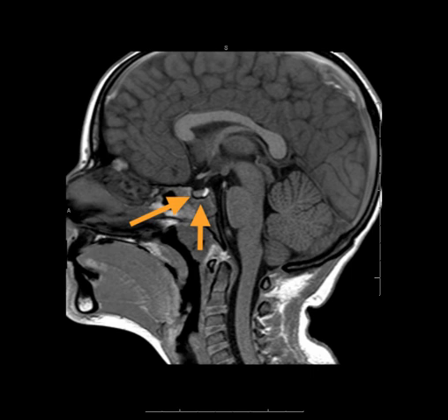The flat portion of the sphenoid bone anterior to the sella turcica is called the planum sphenoidale. Anterior to that, just behind the nose, still in the intracranial compartment at the midline of the anterior cranial fossa, is the crista galli, or rooster's crest.